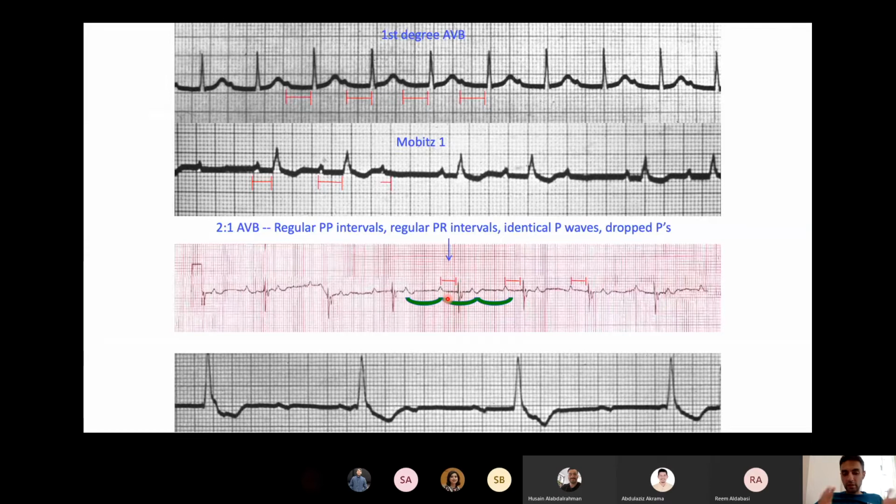This patient, let's say, is in sinus rhythm, and you see at some point prolonged PR here and here. So then you think of an AV block, and obviously this is complete heart block, because the PR interval is all over the place.